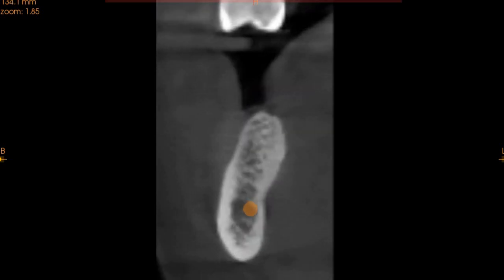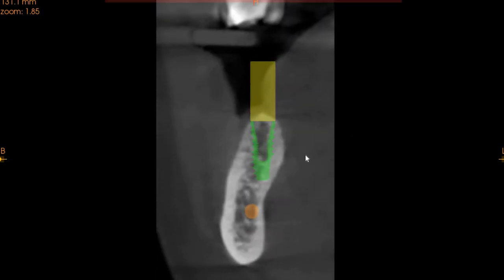Moving to the implant in the first molar region, here the ridge gets significantly thin. So even though we've used a 4.3, a 4.0 implant used here is going to yield significantly better results. If we use a 3.8 mm implant in this region, then even the results might be slightly improved, as you can see right here. When we use a narrower implant in this region, we'll have better results.